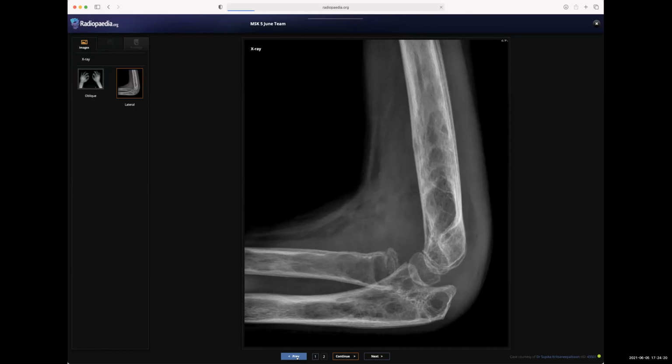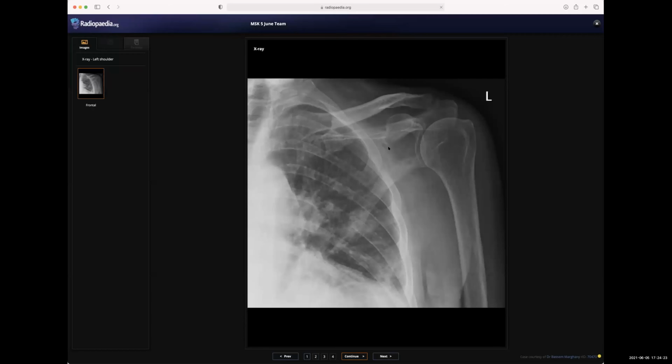Going back to the previous case, you are very much right to think about metastatic disease. It's only here. There is nothing in the distal clavicle, and this was renal cell carcinoma. I think here these were not shown on the CT, but I think there could be some pulmonary mets as well. Okay.